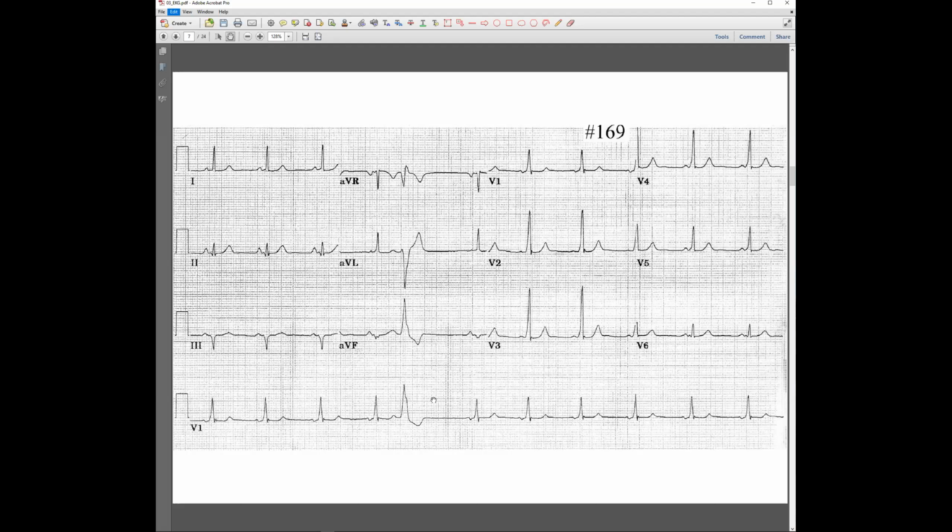You don't see the P wave, the P wave is missing. Okay, that's a ventricular premature beat. Period. That's great. Okay, go on. And then I got the axis. Looking at lead 1, it was positive.